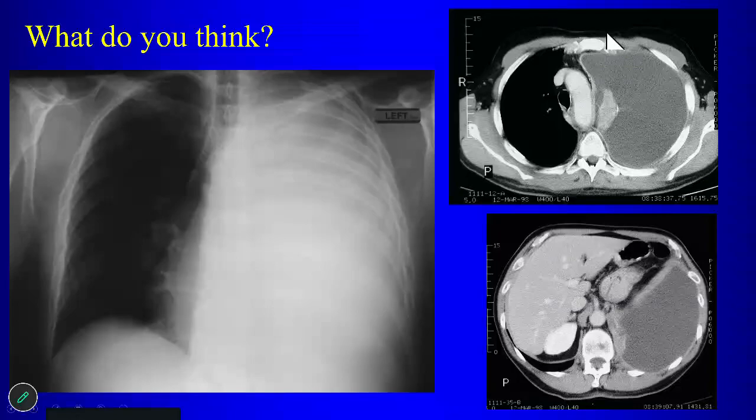Here's a patient with a large pleural effusion. But note, whenever there's pleural fluid, look carefully at the pleura. If there's nodular pleural thickening, if there's pleural thickening involving the mediastinal pleural surface, you're worried about neoplasm.